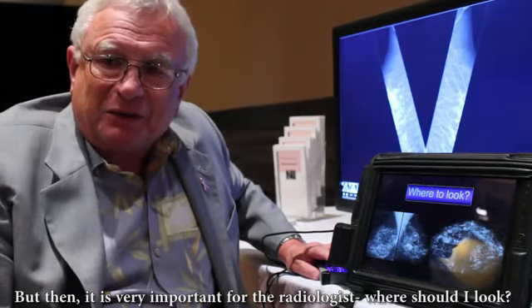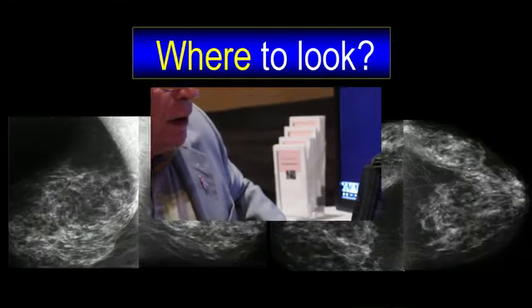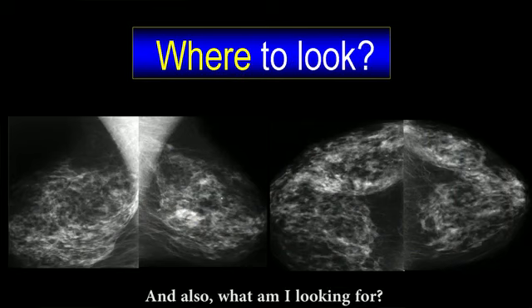But then it is very important for the radiologist, where should I look? Where am I going to find most of the cancers on this mammogram? And also, what am I looking for?